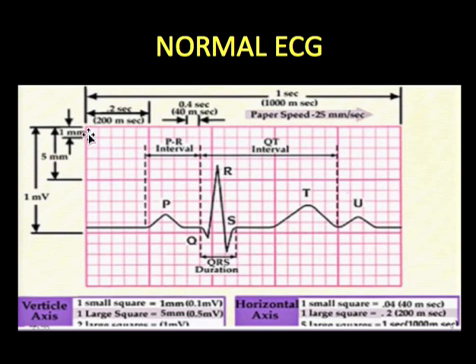Now, let's look at this one big square here. We're talking about the horizontal axis. So this is the horizontal axis. This one big square is comprised of 25 small squares. Or if I'm looking at the horizontal axis, I can just say these 5 small squares, 1, 2, 3, 4, 5, the thin red lined 5 small squares, make up this border of one large square.